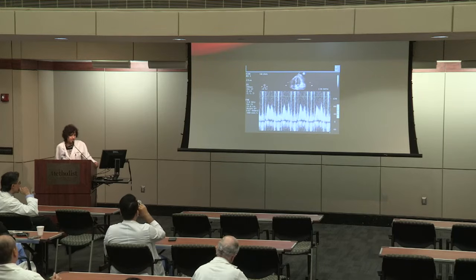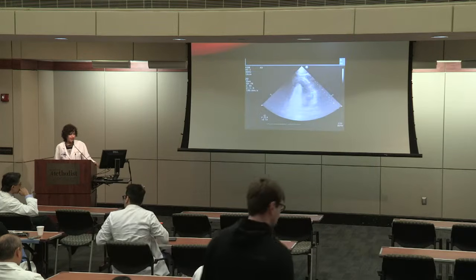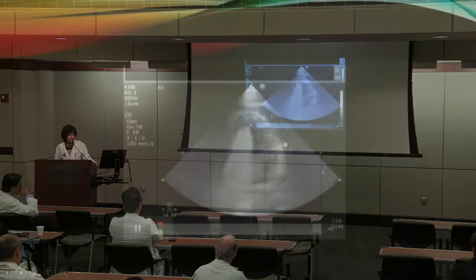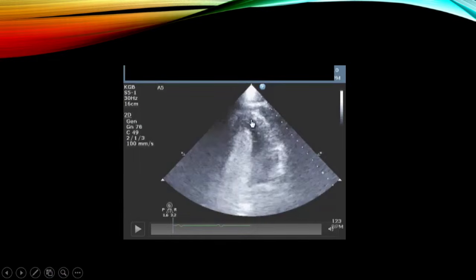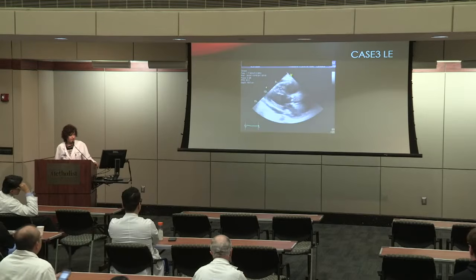We didn't have a respirometer on this patient, and this was the only sweep speed available. And you see there is no significant variation, but again, the sample size is very small. So technically, for the technicians, you would want more sampling and a change in sweep speed with a respirometer. I chose this case to show you because when we gave contrast, you see contrast light up in the pericardial space, indicating there is a collection of blood, possibly a leak somewhere. Again, that's an interesting case for you all to see.